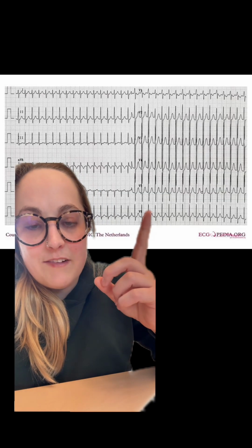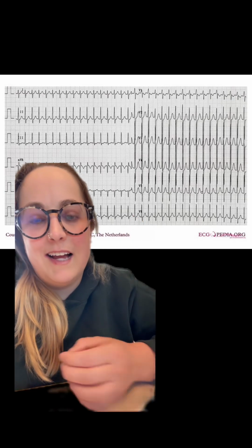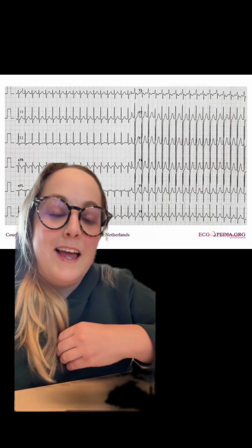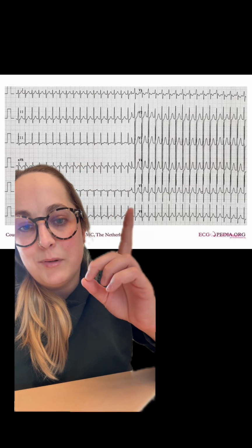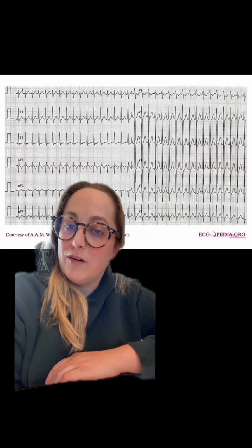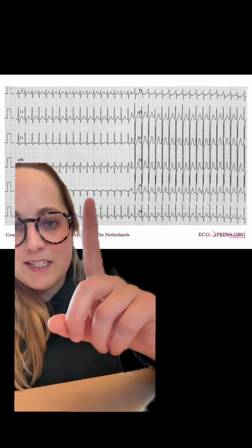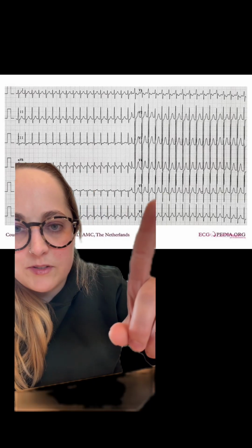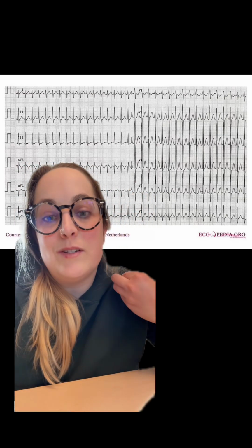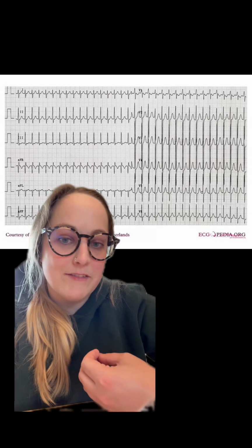Another easily identifiable dysrhythmia is supraventricular tachycardia. SVT initiates in the atria of the heart, similar to atrial flutter, except there's no blocking by the AV node. In SVT, you usually have rates over 150, sometimes well over 200. Your P waves are usually obscured in your previous conduction cycle because your heart is just beating so fast. When people are in SVT, it's usually not very comfortable.